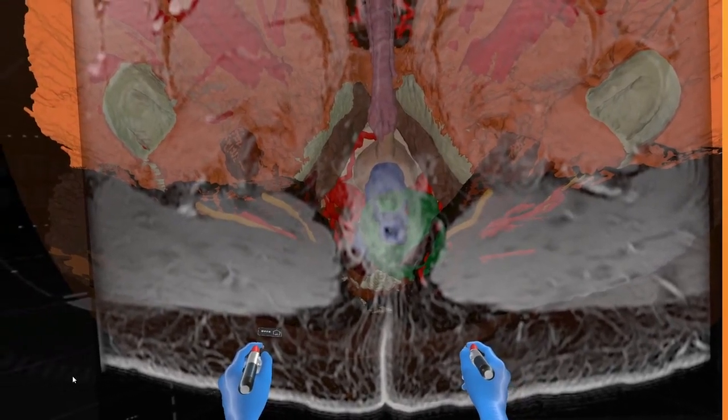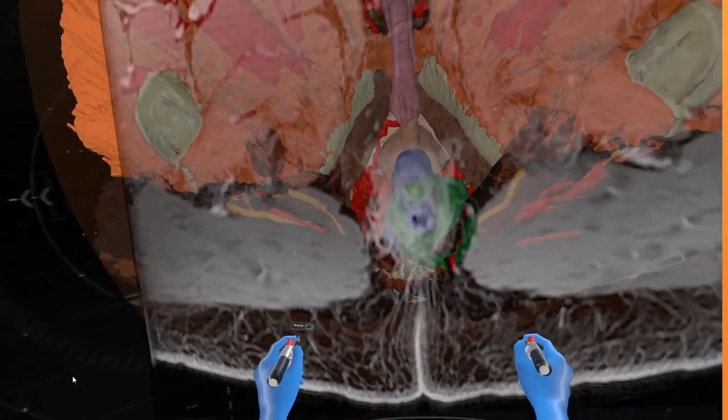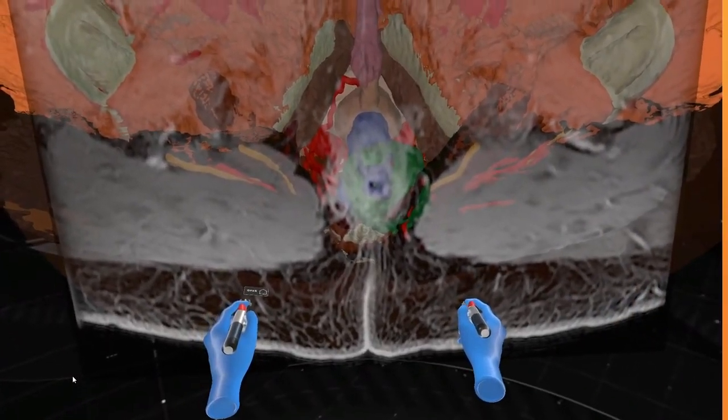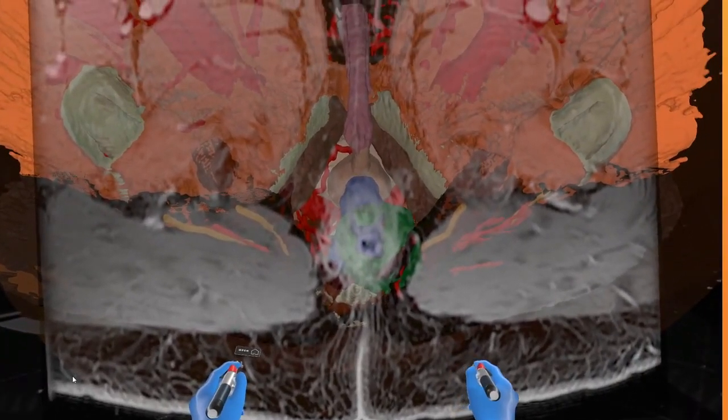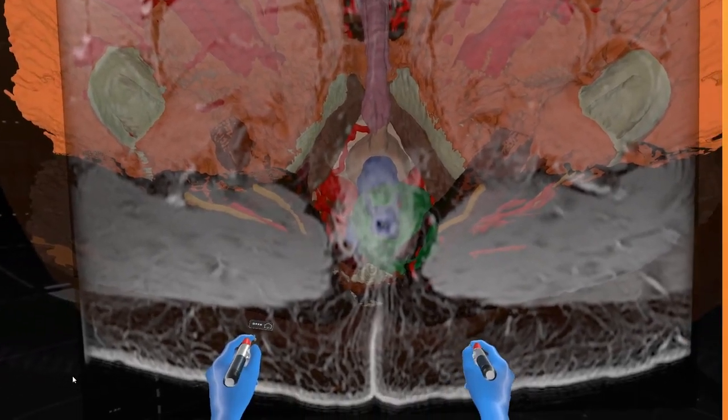This technology provides the clinician with a three-dimensional interactive model generated from preoperative imaging and can be constructed with a turnaround time of less than 1 day. It has potential applications in the area of surgical planning, surgical education, and surgical simulation.